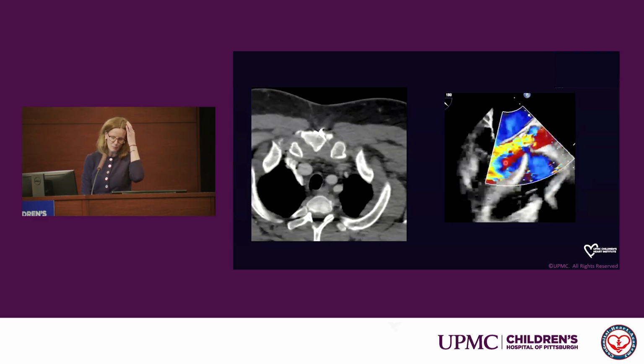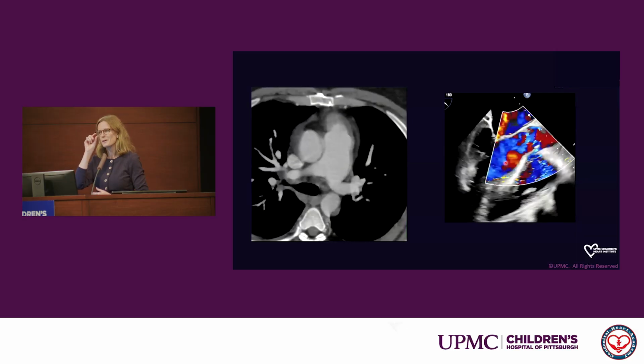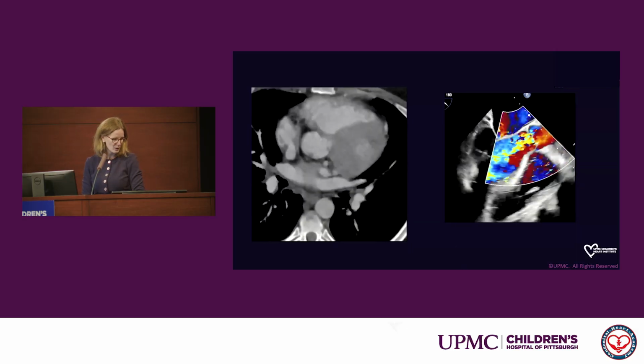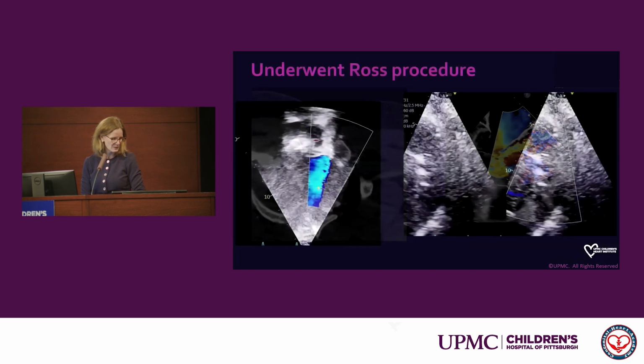This is a TEE from his preoperative study where you can really see a wide swath of aortic insufficiency coming through that previously operated on aortic valve. You can also appreciate the significant LV dilation on the CT as well.